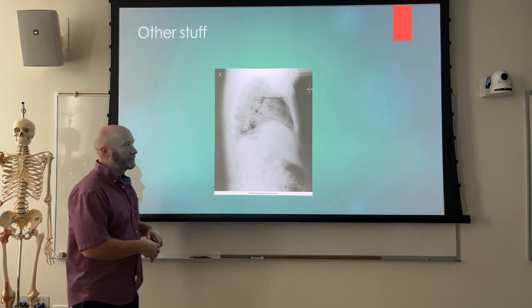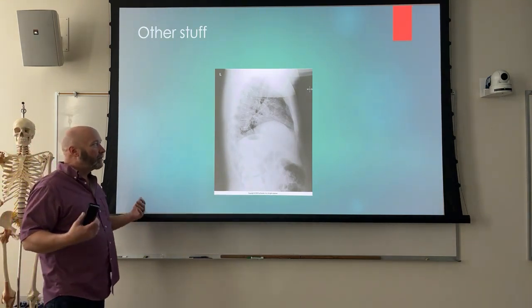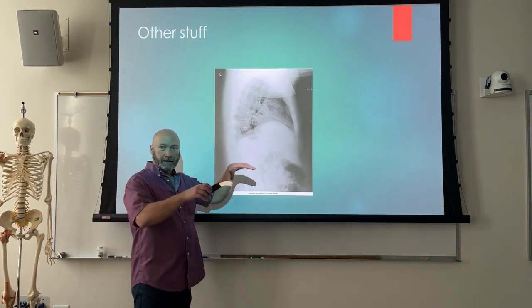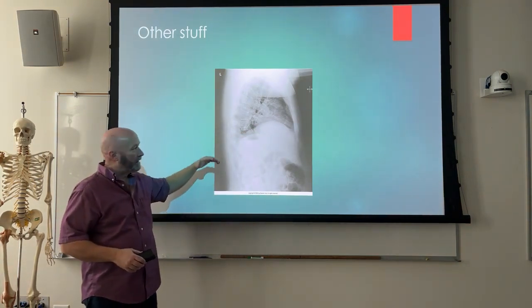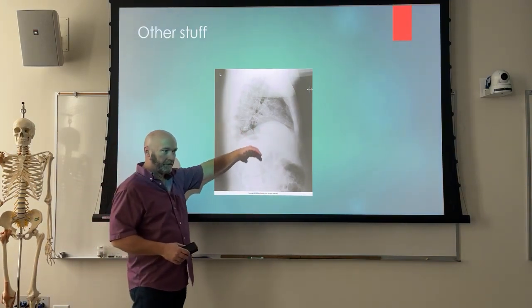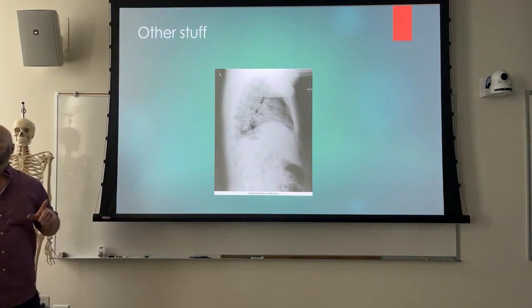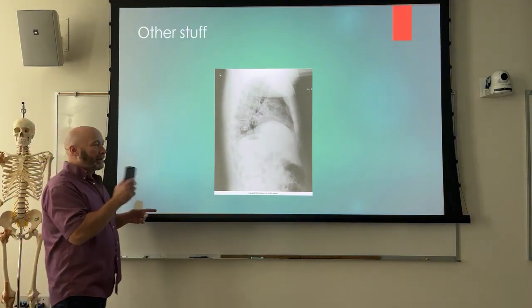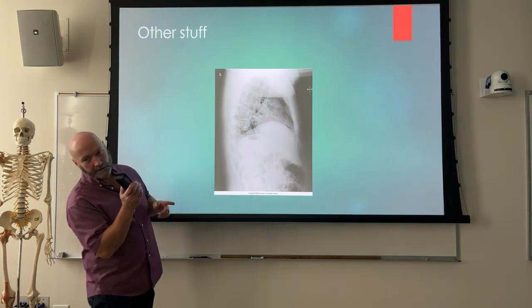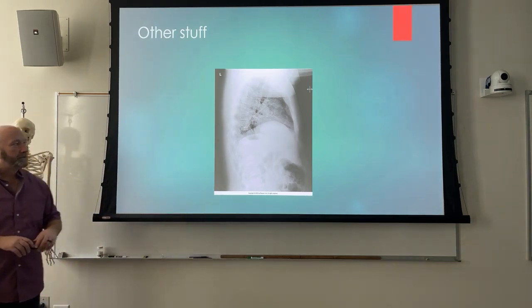We've got a lot of soft tissue there, so the patient's probably got broader hips, narrower shoulders, probably leaning into the image receptor, and that's going to give us a vertical separation, and our gastric bubble is lower and under the lower diaphragm, right? So leaning towards the image receptor. What we're going to call that is mid-sagittal plane tilt, all right? So we've got tilt towards the image receptor, tilt away from the image receptor. That's what we're looking at, tilt towards the image receptor.